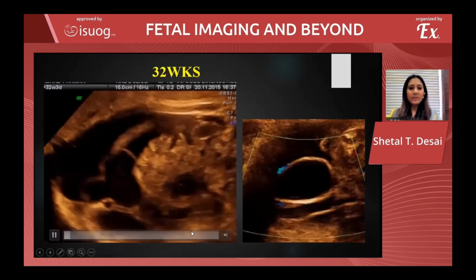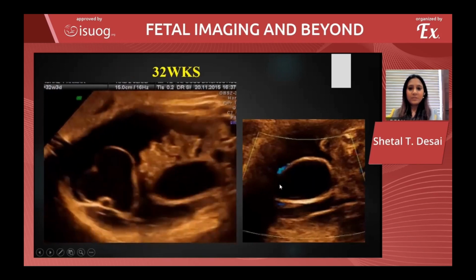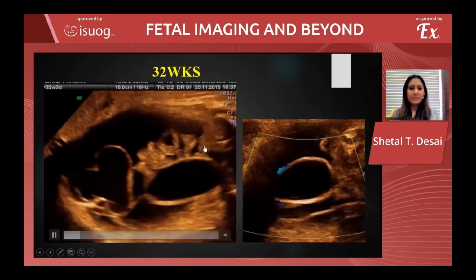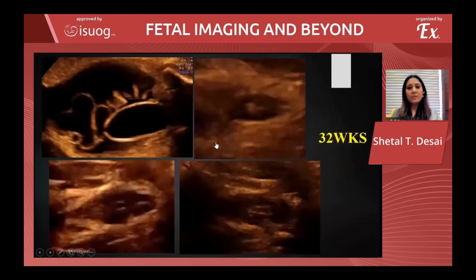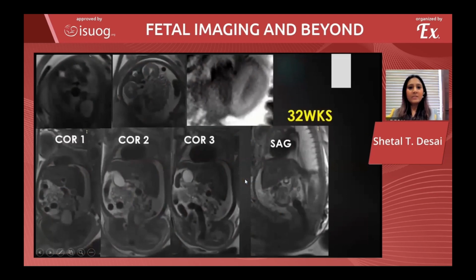As you can see, there are multiple cystic structures in the pelvis with the bladder identified by the iliac vessels, and there is associated ascites. As I told you, the first step that we do in evaluation is to look for the perineal opening. Here the target sign is very well seen. The two perineal openings are seen with ascites and multicystic structures. So this tells me that this is likely to be a urogenital sinus malformation.